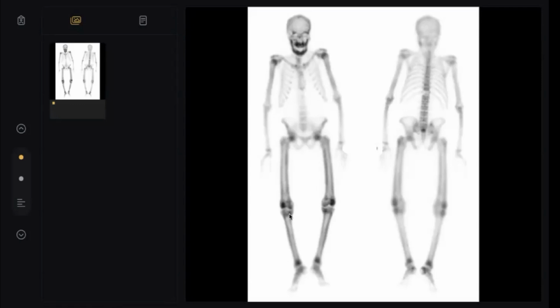No expansion of the long bones, and no obvious cortical thickening. By the way, no periosteal reaction here, to exclude hypertrophic osteoarthropathy. Then, doctor, it looks like it is due to metabolic disease. The most common is hyperparathyroidism. Whatever the cause, the most common cause of hyperparathyroidism in the UK is renal failure. So this is almost certainly renal osteodystrophy.